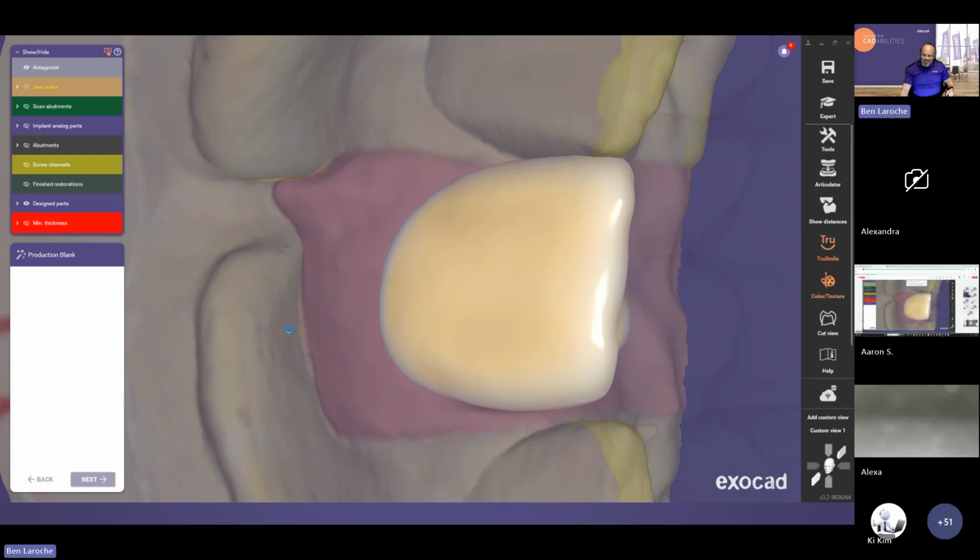We'll get there, guys. And then I want to show you one more thing as soon as it's done. It's processing here.